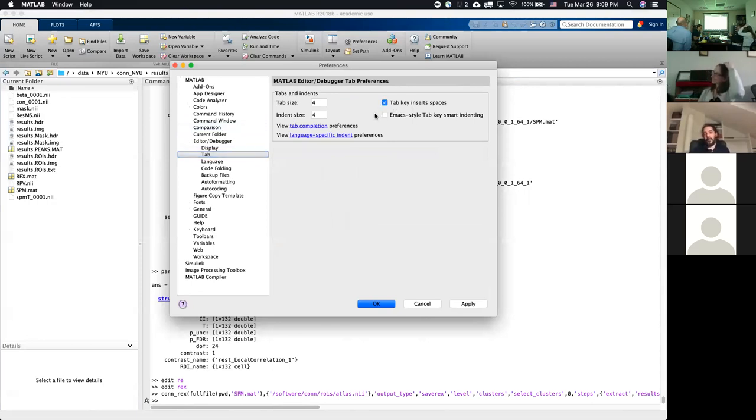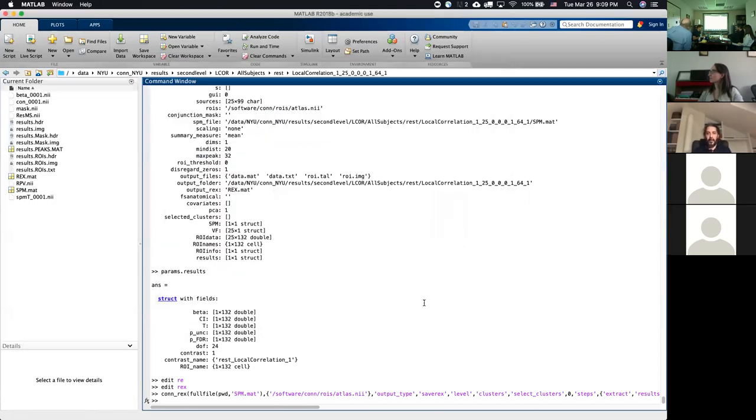But this is difficult to know for programming in general. It's clear. If you want to use MATLAB, remember to uncheck this thing so that the tab is interpreted as an actual tab instead of multiple spaces. No problem.